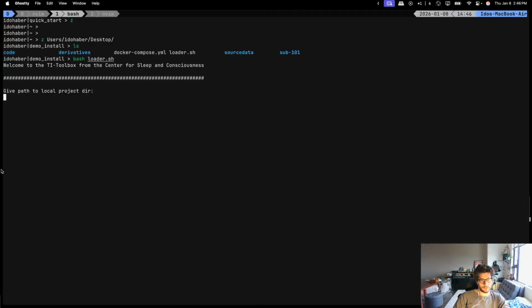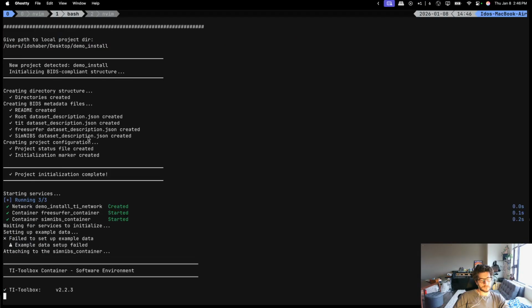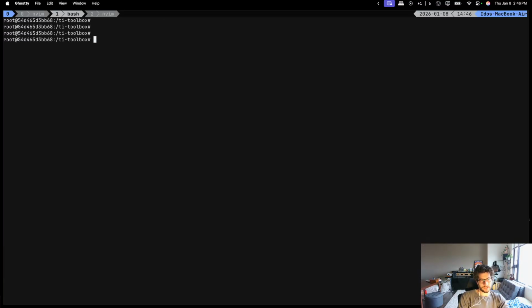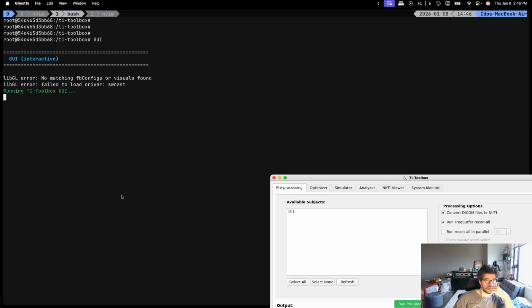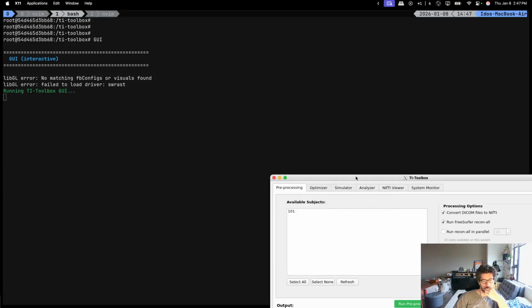You can do the same on Windows and paste. And we are in it. And then we can call the GUI. And here we are.